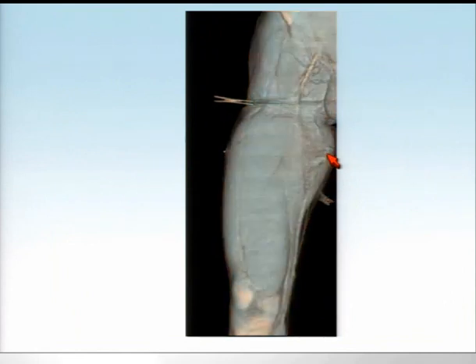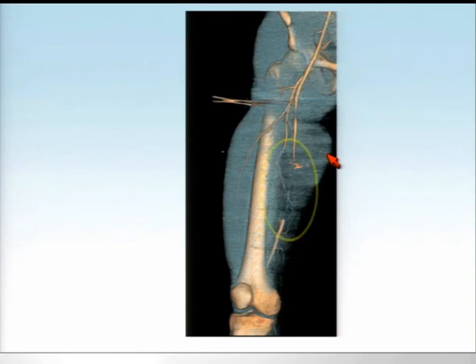Another nice example of entry or exit wound within the medial thigh, and we can dissect into the iodinated structures here, and as expected, again, we have an injury, an occlusion of the SFA, active hemorrhage in the location that we would have predicted in this penetrating trauma.